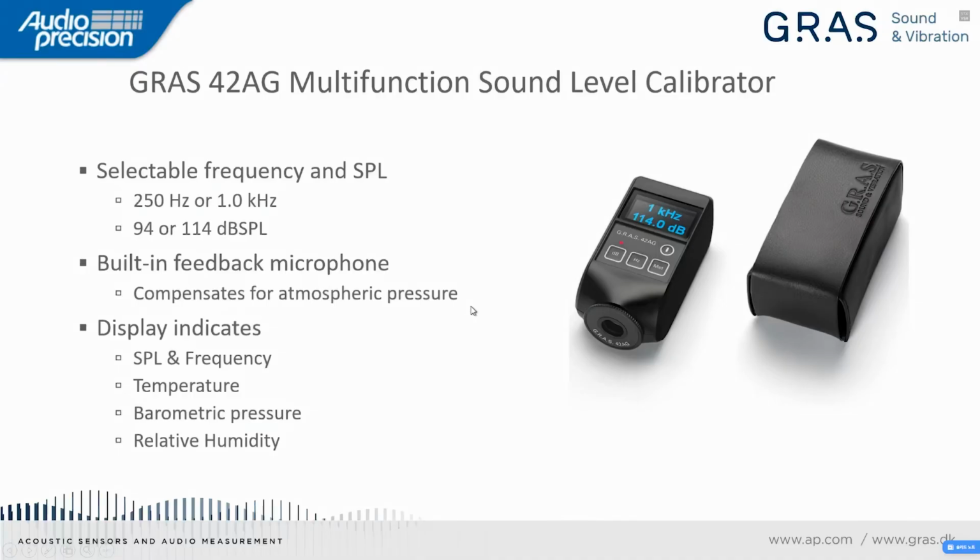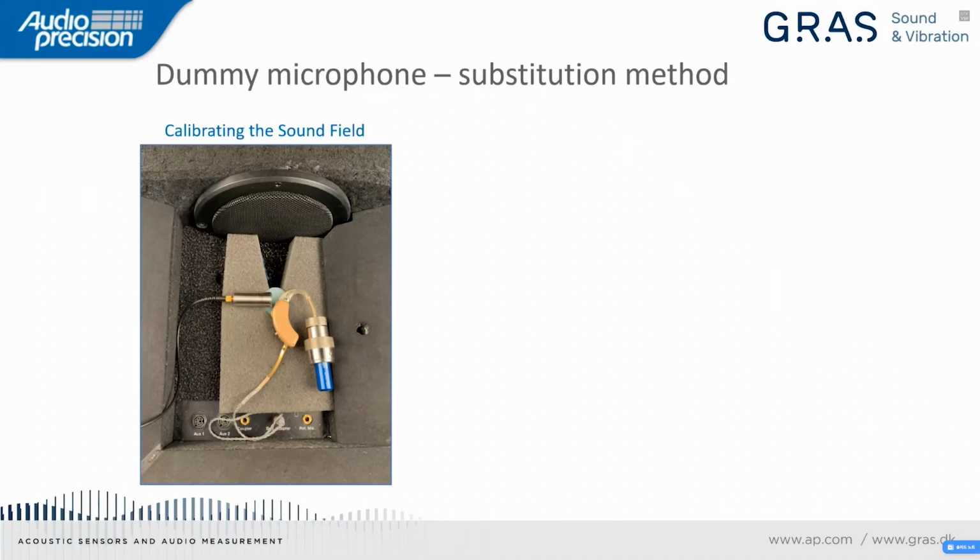Now, the dummy microphone, I wanted to explain what that's used for. So there are 2 ways of conducting these tests. One is called the reference microphone method, and the other is the substitution method.